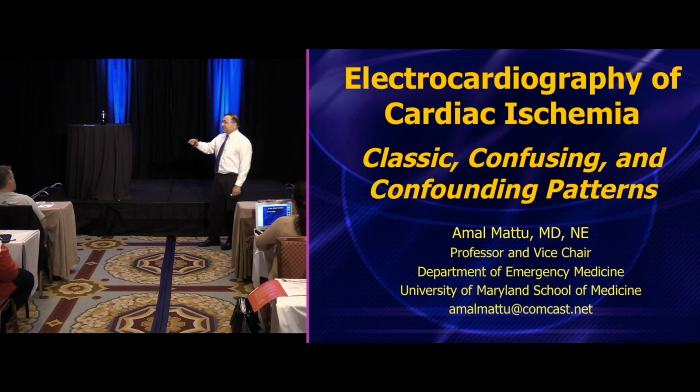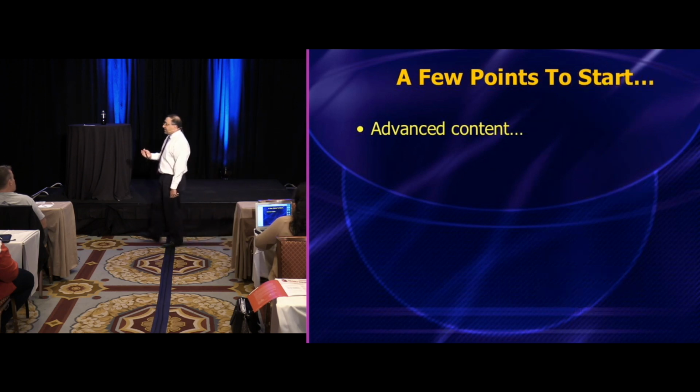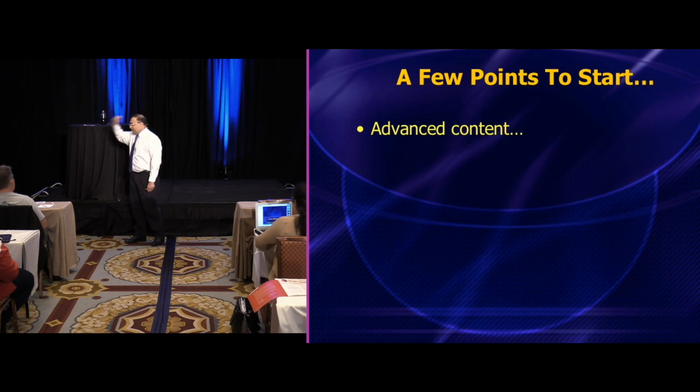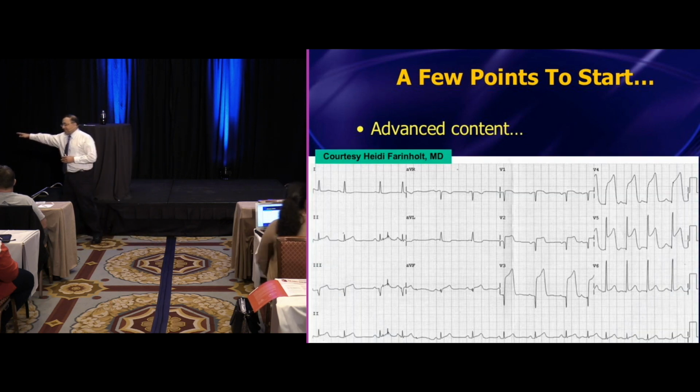Now, as we go through this, it is really not intended to be a basic course. I'm going to make the assumption starting out that everybody has a decent knowledge of how to read EKGs. So if there's anybody here who's looking at this EKG, scratching their head thinking, I wonder what's going on, this is probably not the right room for you, all right? So we're going to skip over stuff like this.